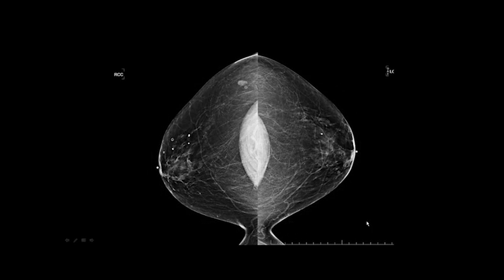They don't want to see that. Maybe they're not going to give you a deficiency, but they will mark it on the papers that they give you. So these aren't bad. They're pretty good. They want to see a symmetrical pattern. They want to be able to draw that circle all the way around when they put both images together.